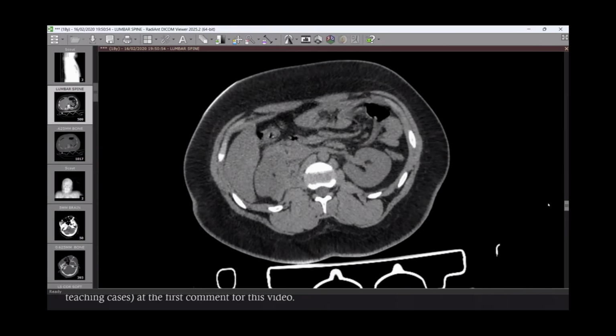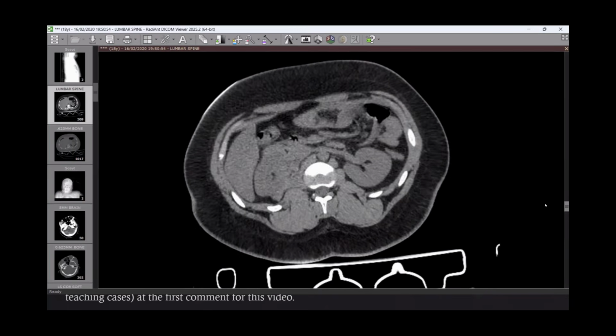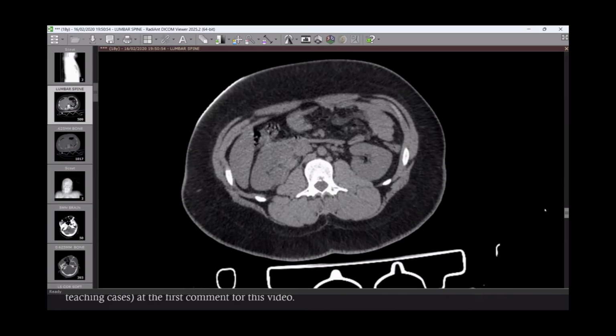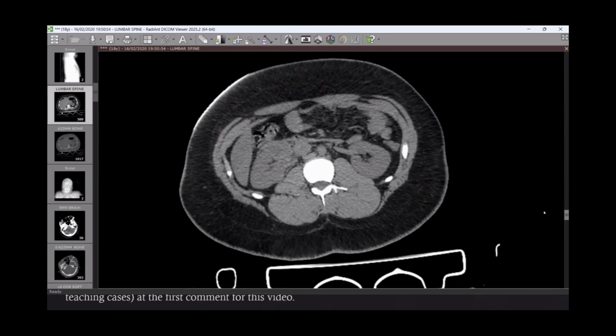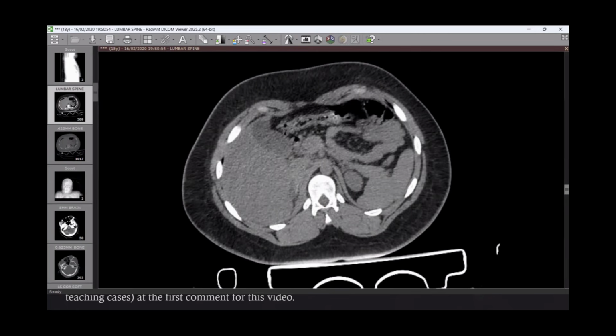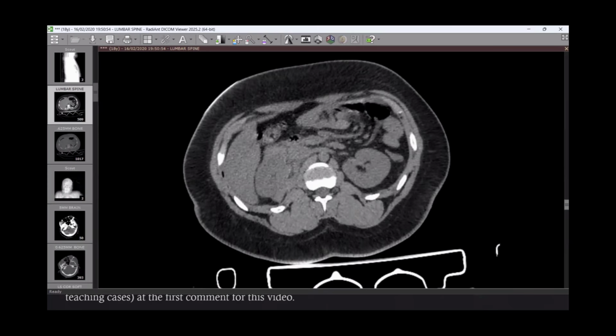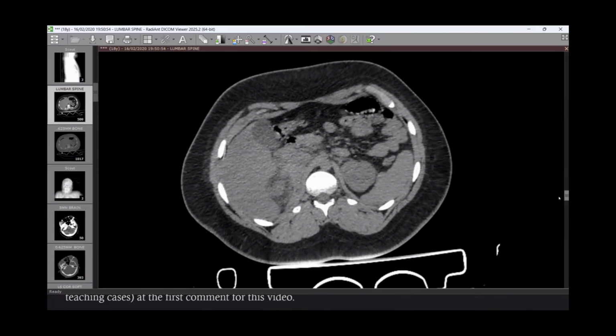And where is the laceration of the liver? I couldn't. Yes, that's correct, because this is a non-contrast scan. The standard is a contrast enhanced CT scan of the abdomen. In any case of trauma, if you have in the FAST scan any free fluid collection, please do the standard. But in this case, really, it is a challenging case. It's non-contrast. Can you give me the precise location of the fluid collection?